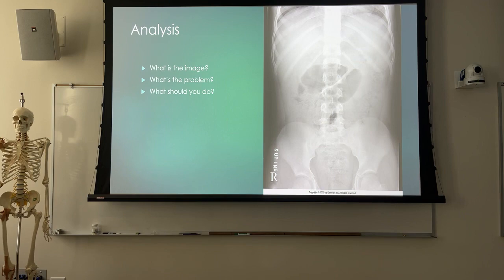Oh. What, you just do a bladder? Bingo, bingo. Just do a bladder shot. You know, this is a young patient. You can kind of see where you've got some plates that aren't completely sealed up here, right? So this is a young patient. You certainly would not want to go back in and reshoot the entire KUB. If you need to make sure that you include the symphysis pubis, just do a bladder shot. Top of the image receptor at the ASIS, or top of the collimated field, since you're using one image receptor size, top of the collimated field at the ASIS, and just do a bladder shot.